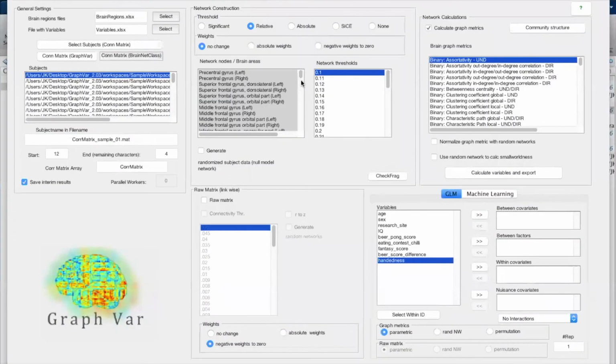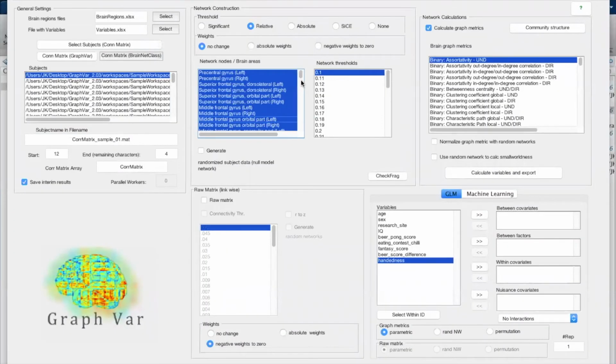And as I showed you in the previous videos on the introduction of brain network analysis, it makes sense to threshold this fully connected matrix, because fully connected matrices are not really likely to exist in biological organisms, maybe as the brain, because it would be really cost expensive to maintain all those links, right?